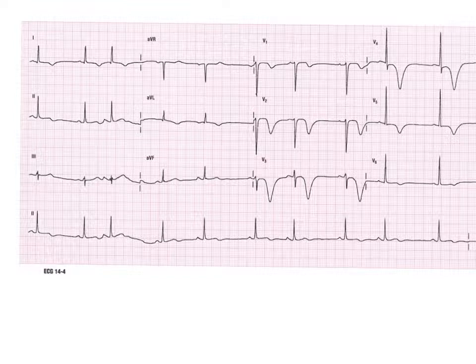Do not have a wide QRS. I do not have a strange QT interval, although it might be a little close. But when I look at that rhythm strip down there, it's pretty obvious that it's not. So don't have a QT problem. Axis is fine, not wide, no bundle branch issues.